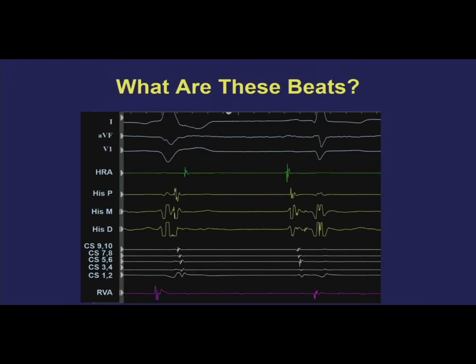So there are several steps. The way I would methodically go through it is, the first thing that I would say is the ventricular events precede the atrial events. That sounds simple, but until you start thinking logically like this, when you get into more complex scenarios, you're going to be thankful that you think it through this way.